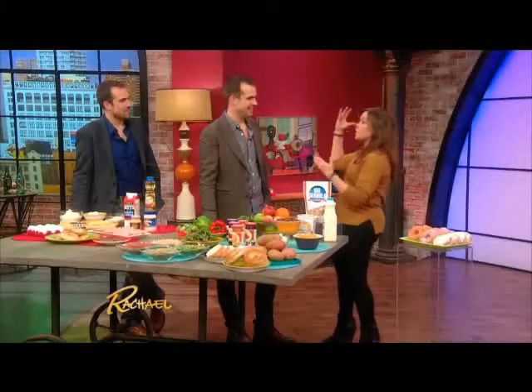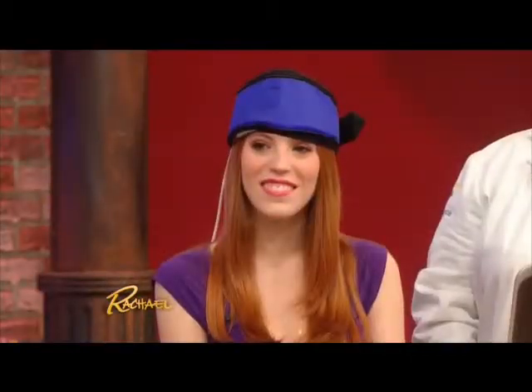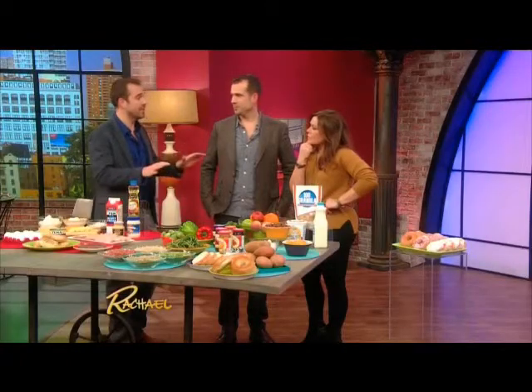So what are we going to be looking for here, guys? As Jennifer says, you've basically got a gas pedal which says keep going, and you've got the brakes in your brain which say stop, you've had enough. And when we look at the results for Amanda, what you see is for the broccoli, the brakes are on fine. That bit of her brain is saying you don't need to eat anymore, you've had enough broccoli. But with the chocolate, that bit of the brain doesn't do anything at all, doesn't tweak. So you will keep going. Let's take a look at what that looks like.